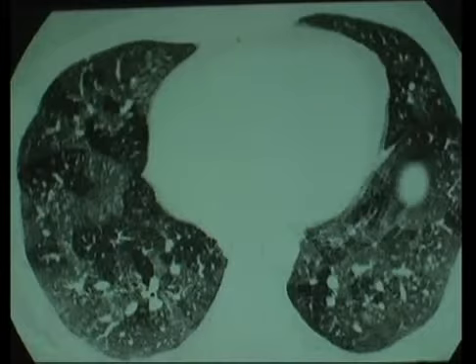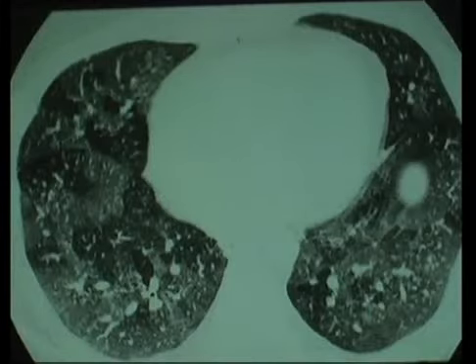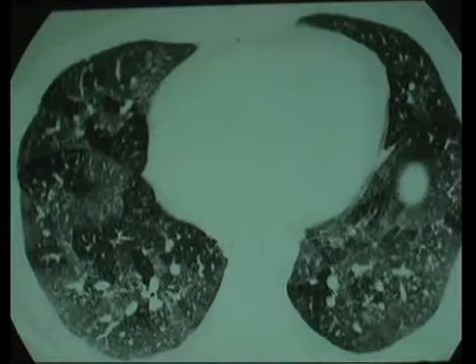It's just a million little nodules all over the place. And sarcoid can, because it involves the central airways, cause air trapping. So that's well described. If you see these kind of zones, now what you're actually seeing are secondary lobules. Here's a classic one out here. You're seeing it not because there's disease along the edge. You're seeing it because the airway to that secondary lobule has been clogged up. So again, look for that.